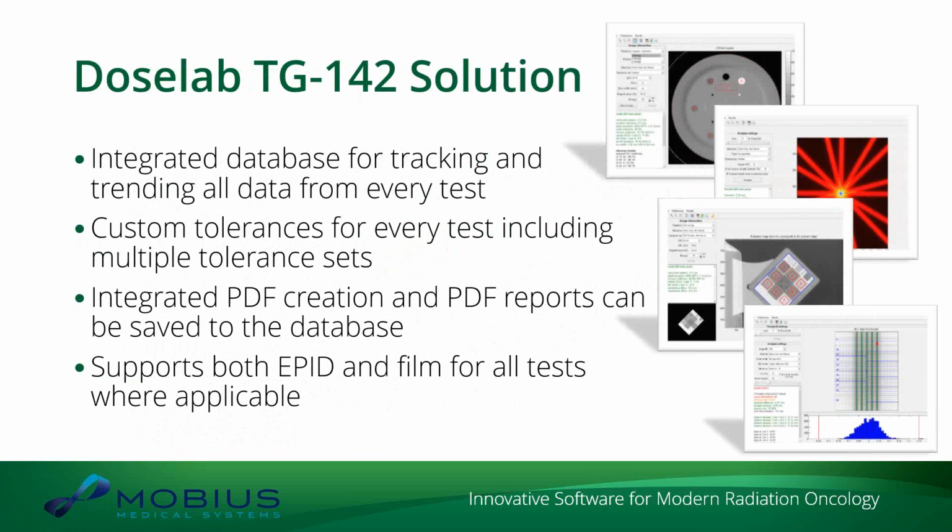Integrated PDF creation and PDF reports that actually can be saved to the database. I think we're the only ones who do that. And we support both EPID and film for all the tests where it is applicable. There are certain places where you can't use an EPID, such as a gantry Starshot or a couch Starshot. You just can't use an EPID for that. But anywhere where both can be used, we can do it.